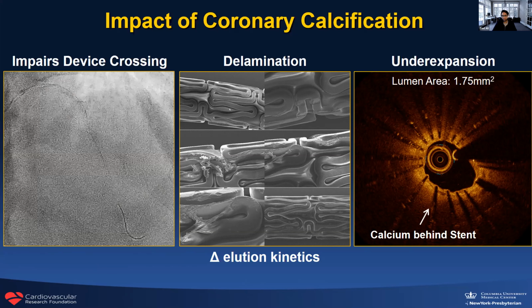What I'm going to talk to you guys about today is advanced OCT imaging guided intracoronary calcium management. So this is past the basics of just seeing and identifying calcium, yes, no. It's a little bit more detailed for those of you who want to integrate this into your practice. Well, the first thing to understand is, why do we even care about this?